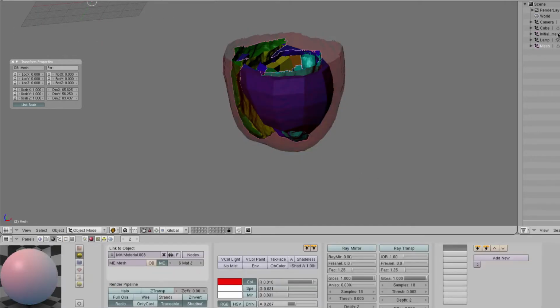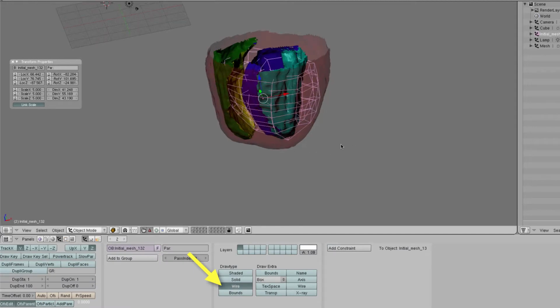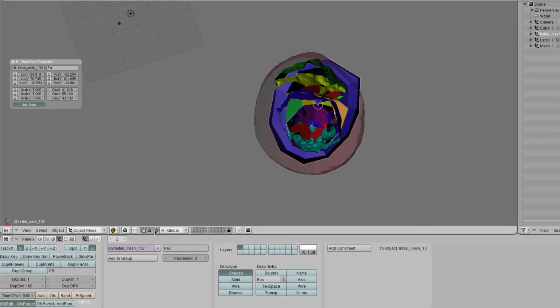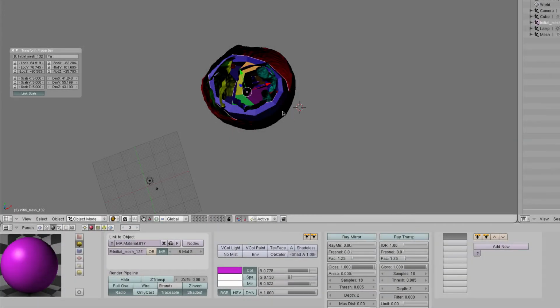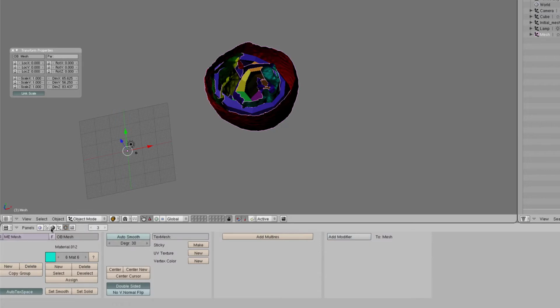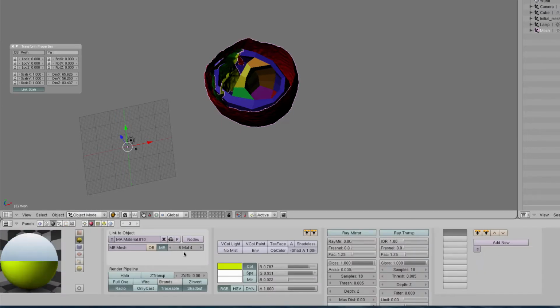It's helpful to play around with transparency so you can see what you're doing. You can also go to wire mode to help you line it up. You also want the right ventricle and other features of the heart to be aligned approximately. When you are happy with aligning the data to the mesh, you will want to isolate only the yellow, or the RV side of the septum. So toggle the transparency of the other materials so that you can only see the septum.